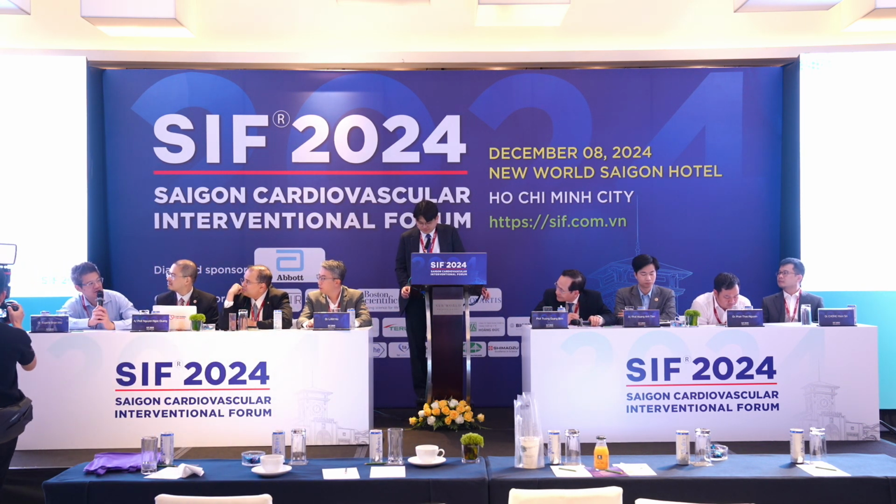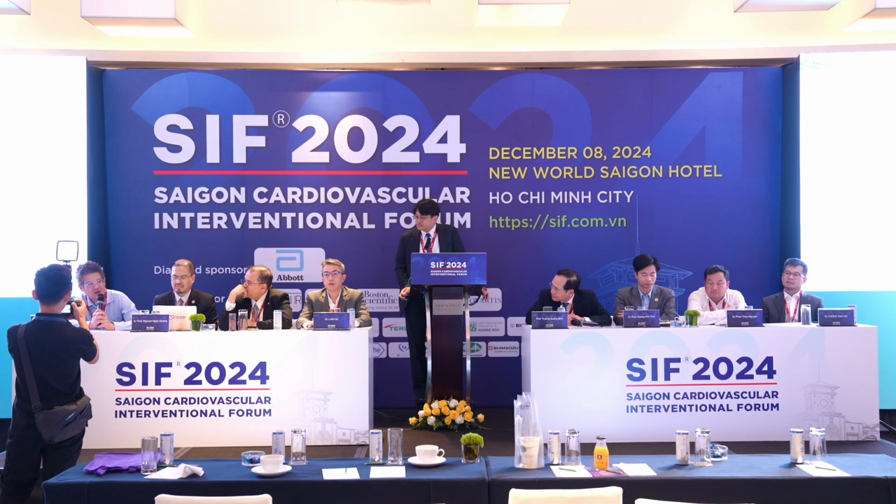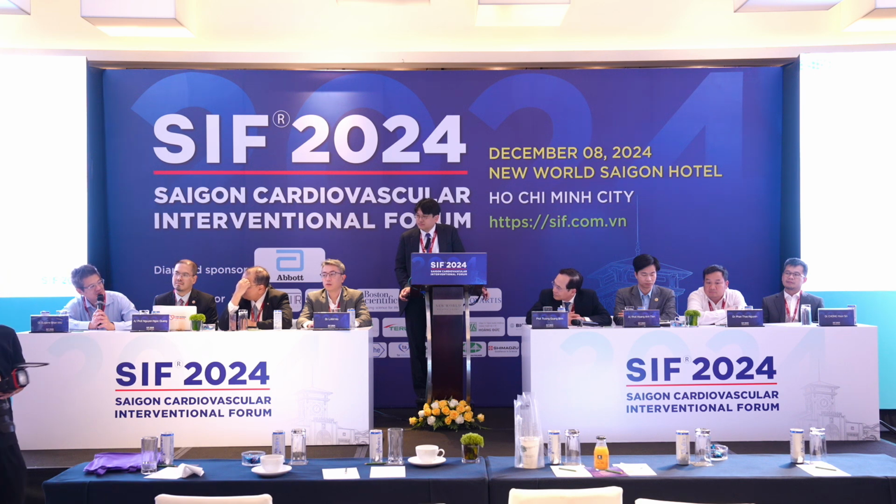So I think the case is very nice. You managed to rescue a very difficult situation. Would you have considered upfront Impella in this case? Because the right was very tight and obviously a culprit vessel, and you affected it. And obviously you don't want to stage the patient because last time he refused his PCI to his LAD. So maybe after doing the right would be a time you could consider using Impella upfront?